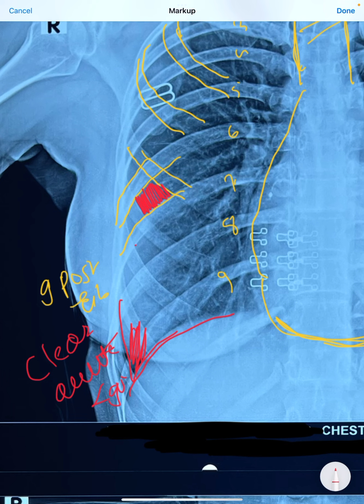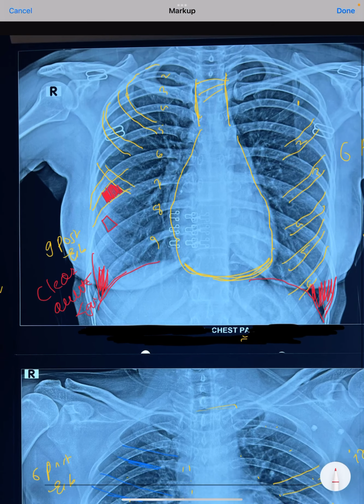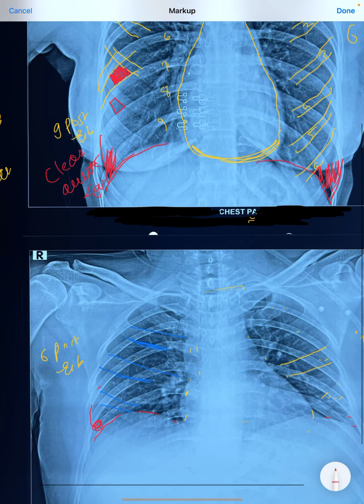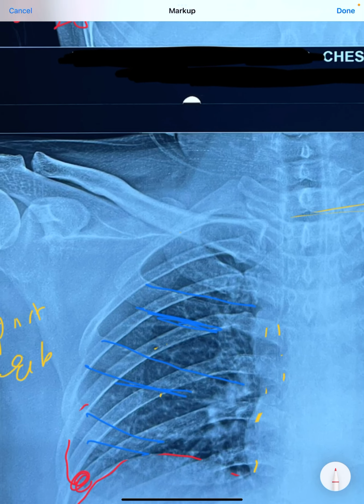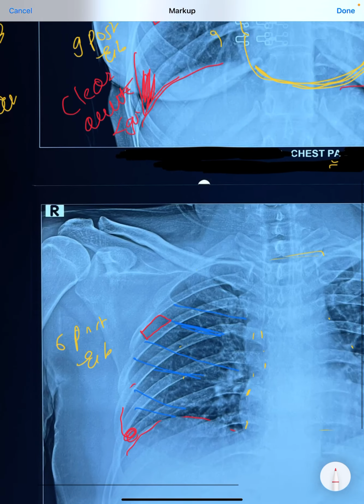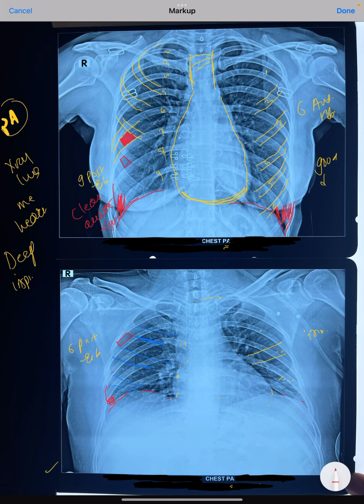We can very well notice the diamond shape because of the oblique nature of both anterior and posterior ribs. But in this X-ray with poor inspiration, this diamond shape is totally lost. You will not be able to see a very good diamond shape because the ribs will be more transverse than oblique.